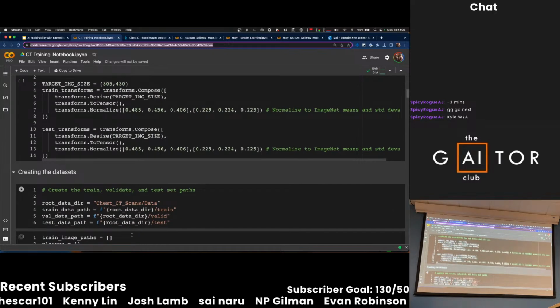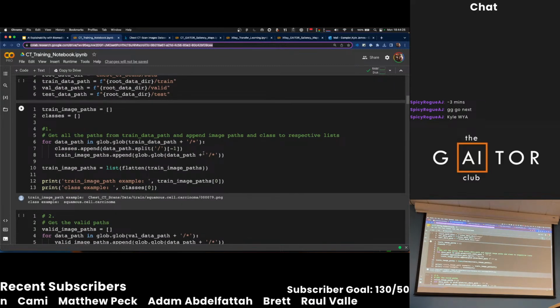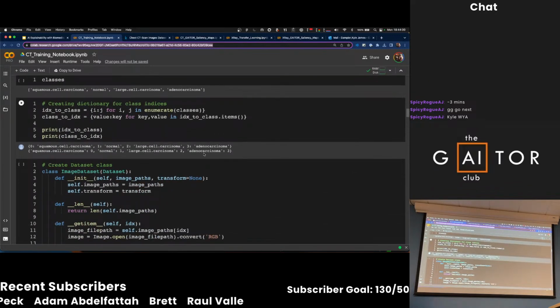Okay, so I define the transformation, and then I create the data sets. This goes through everything in the train folder and gets the class, because it takes the last thing in the file path, which is the label, and appends it to classes, and then I append all the train image paths. I do the same thing for validation and testing. And this is a utility dictionary that tells you which index corresponds to which label, since the model is going to predict a number rather than the label itself, so we want to correspond that number to a label.